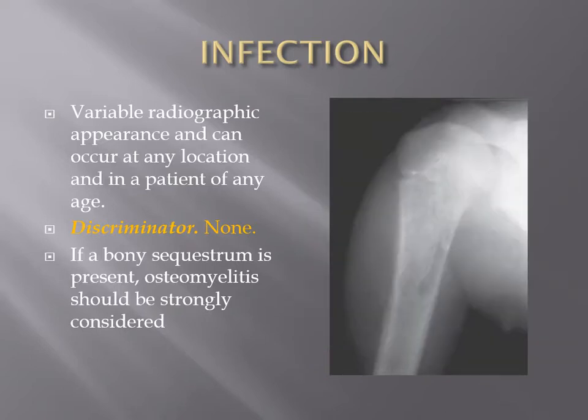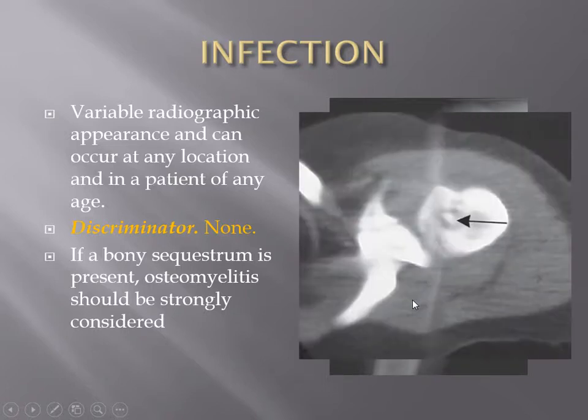So yes, these are lytic lesions as we see here on plain X-ray, and on CT we found the sequestrum. This is strongly suggestive.